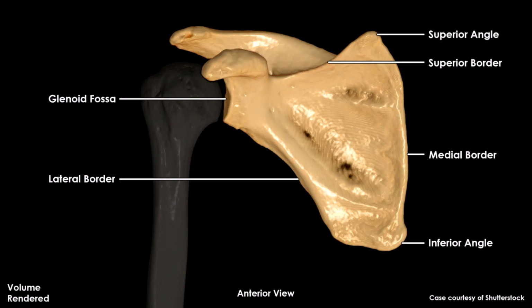Just like all bones, every feature, surface, and structure of the scapula is given special names for descriptive purposes. In this lesson, we'll just observe the basic anatomy that we can see in this image. The anterior surface of the scapula is called the subscapular fossa. Sub means below, indicating that this is the deep surface of the scapula facing the ribs. The subscapularis muscle attaches here.